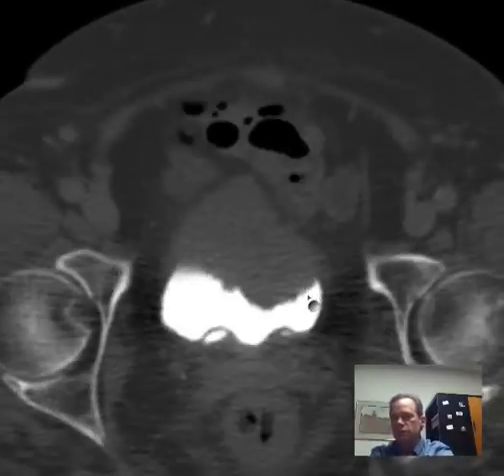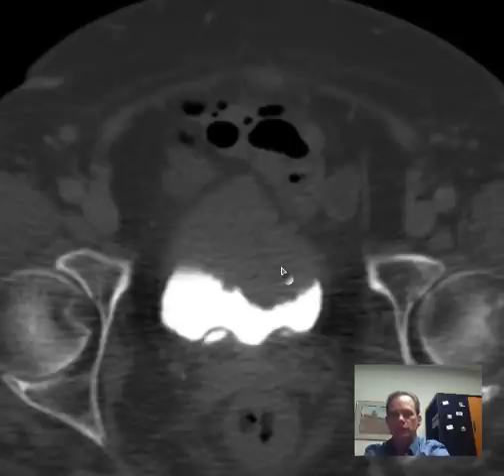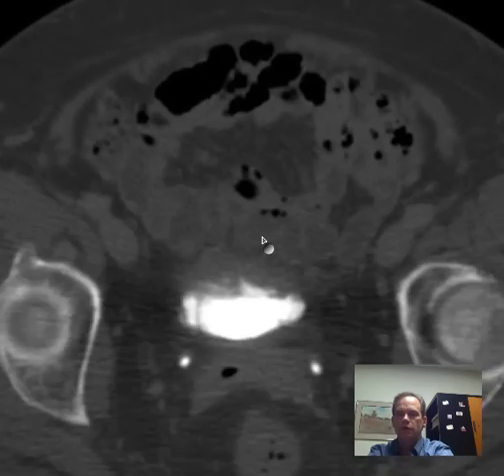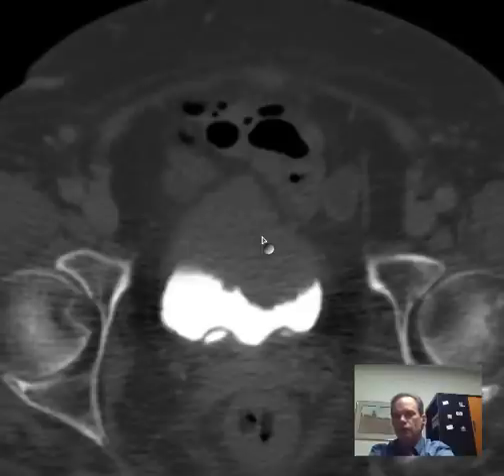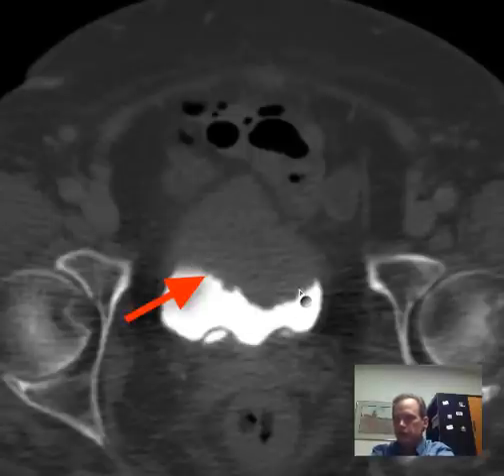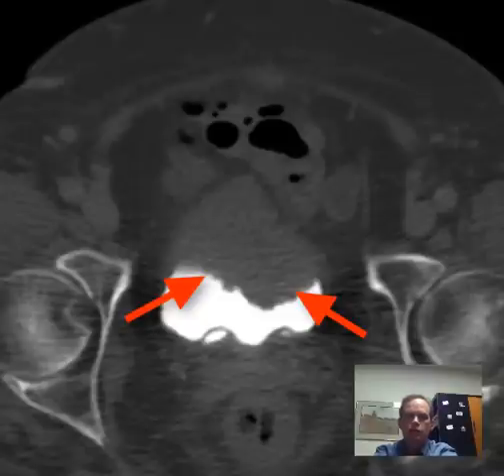This is very suspicious for bladder cancer that is arising in the anterior part of the urinary bladder. And so as the patient is lying supine, the urine opacified comes into the bladder, and it is outlining very nicely this mass, which is a bladder carcinoma.